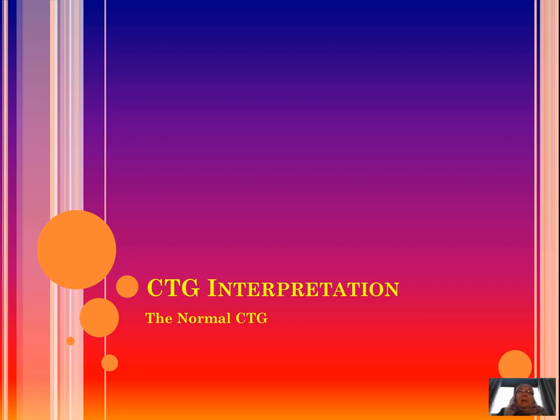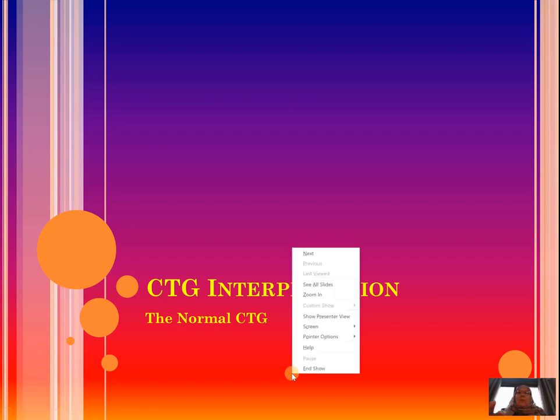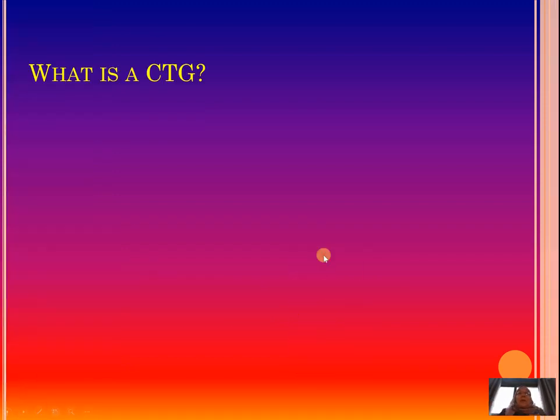In this lecture we will have a look at a number of CTGs, and I would like you to take a pen and paper in your hand, and when there's the opportunity, have a look at the CTG yourself and recognize the features on the CTG yourself. When the opportunity comes, I will let you know, but please have your pen and paper at your side for this. Okay, so let us start.